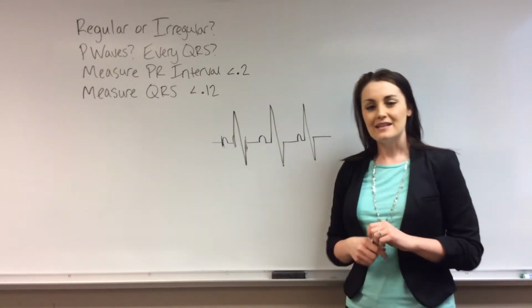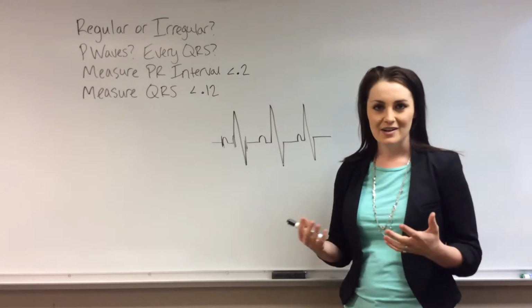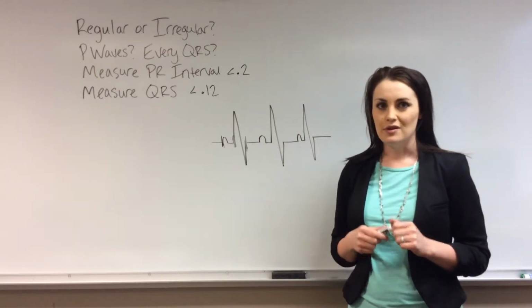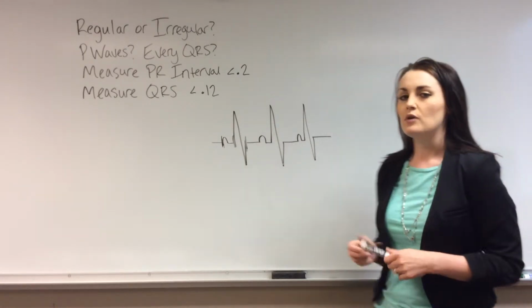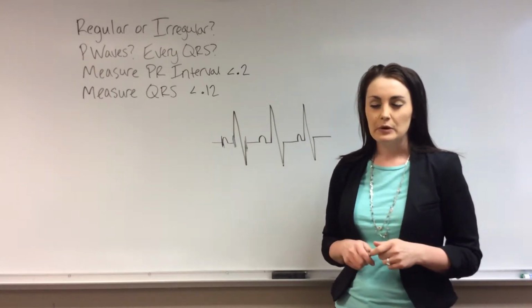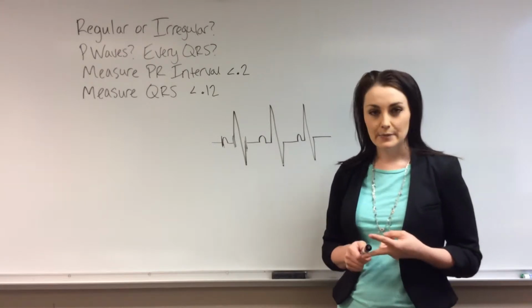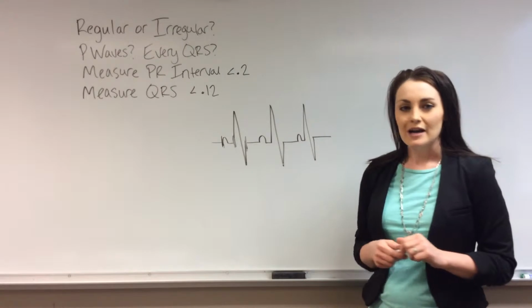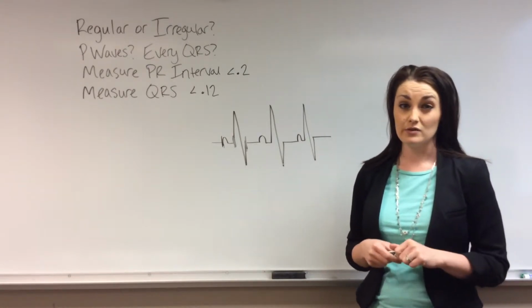And so now that's the method that I use. That's my method of analysis. Of course, there's other components as well, but that will get you on your way to analyzing the rhythm itself. So now, for the rest of this video, I'm going to talk about the different sinus rhythms. So normal sinus rhythm, sinus bradycardia, and sinus tachycardia. And we'll talk about, just briefly, about common treatments for those.